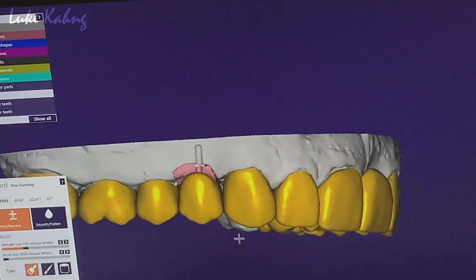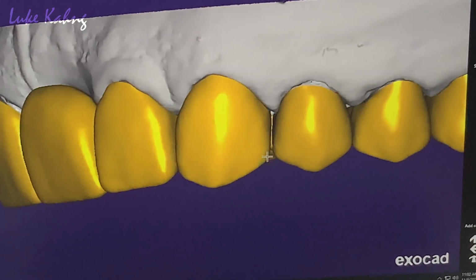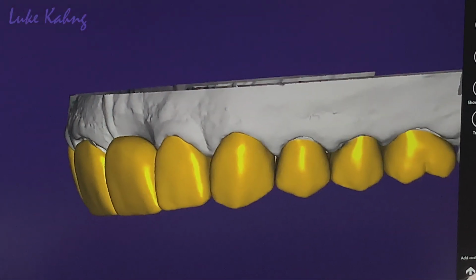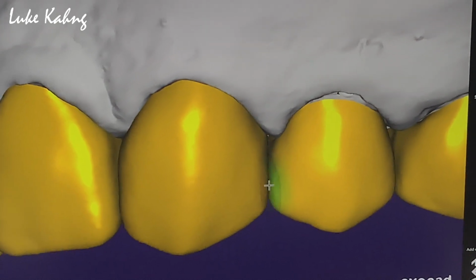So we finished the full mouth monolithic 16 unit implant bridge. This is regarding the long axis, emergence profile, height of contour, canine rise, and individual tooth contour.